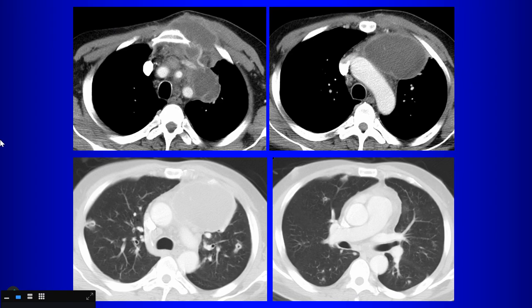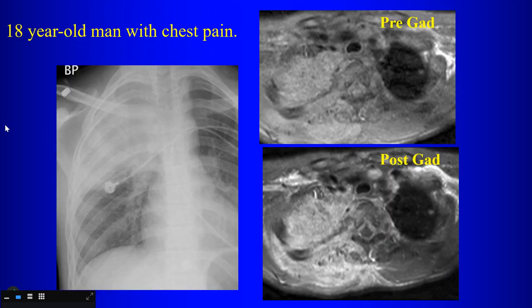So this was a patient with AIDS. This was also nocardiosis. Okay, so nocardiosis can affect patients with AIDS. It can give you masses like this that can also invade the chest wall. So that's not empyema necessitans.